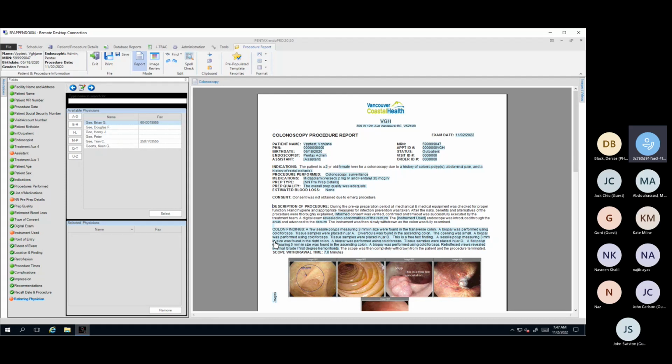In the interest of time, unfortunately, we haven't really got to the bronchoscopy report, but if we could show favorites, because the favorites will definitely help. This looks like a lot of clicking, a lot of work, but once we set up a basic template, you can set your favorites. So if you typically have a similar report and only change the odd field, this is how we'll do it next, and it makes it faster, so you're not clicking 100 items at a time. Perfect. So, thank you. Moving on to the template favorite component.